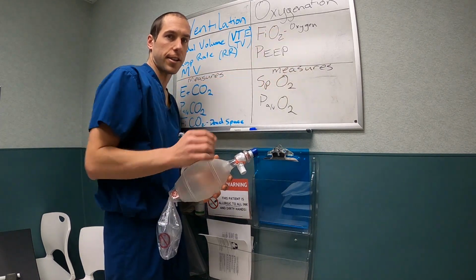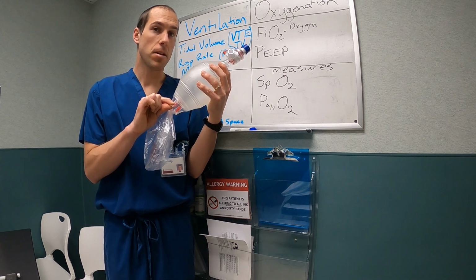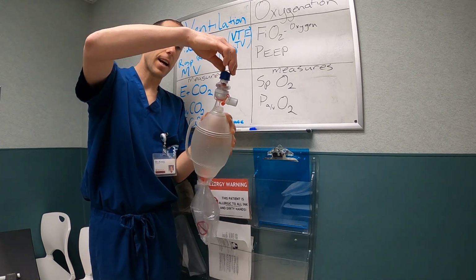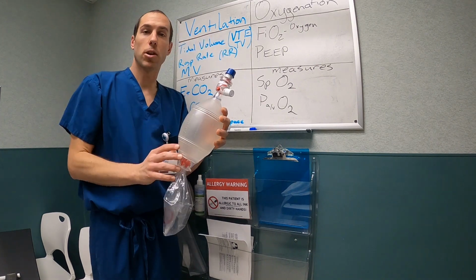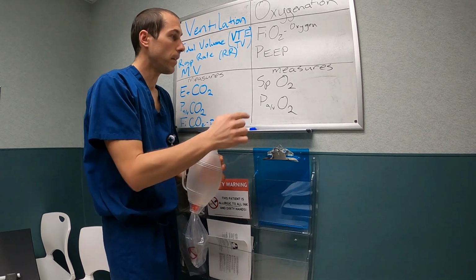On our oxygen side, we have the port where the oxygen tubing attaches. We can titrate that up to pretty much 100%. And we have our PEEP valve, which we can dial in anywhere from 0 to 20 centimeters of water of PEEP. Those are going to be how we drive oxygenation of the patient.